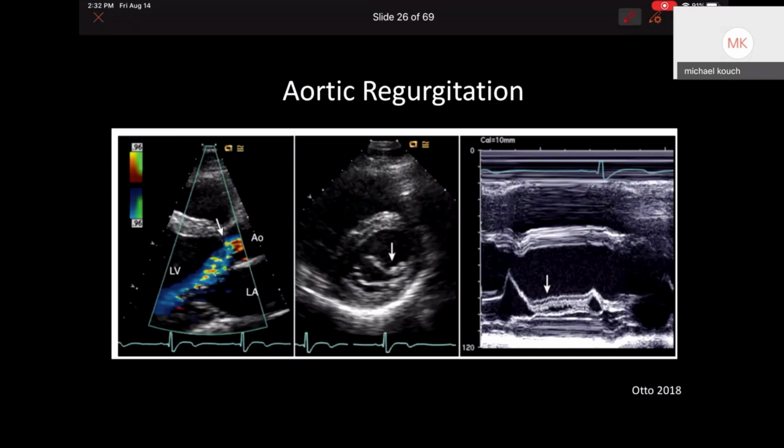All right. So as you have aortic regurgitation, you start to see it pushes that valve closed during that same phase, right? And then your E wave is barely existent here. Okay. And so if you were to look at your mitral valve in your short axis view, you can actually see that valve bowing inwards.